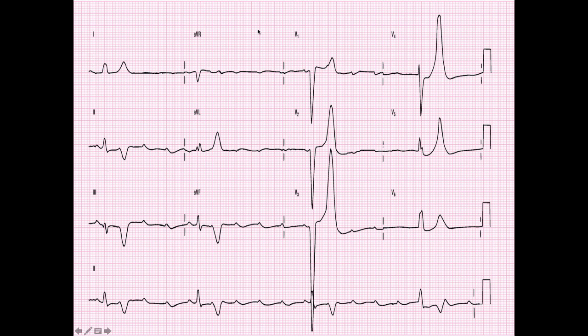So what do we see here? I see QRS complexes. They're super slow. You're right. Really slow, but regular. Let's look down at the bottom, this running lead 2. QRS, QRS, QRS, QRS. And then all these little guys in between. All these P waves. Our P waves are regular as well. Imagine that. But our PR intervals are irregular. So we have a third degree AV block.